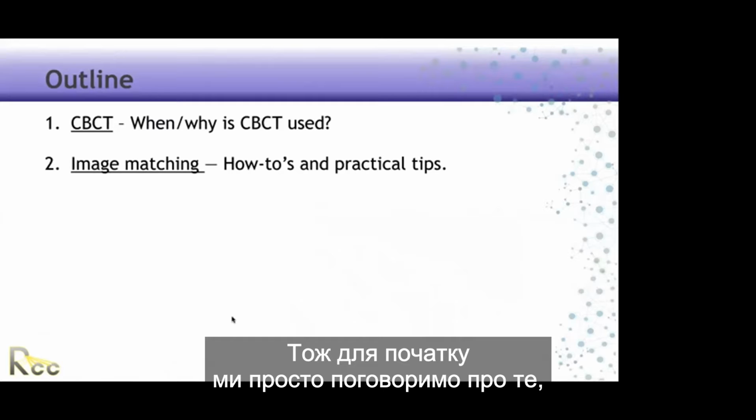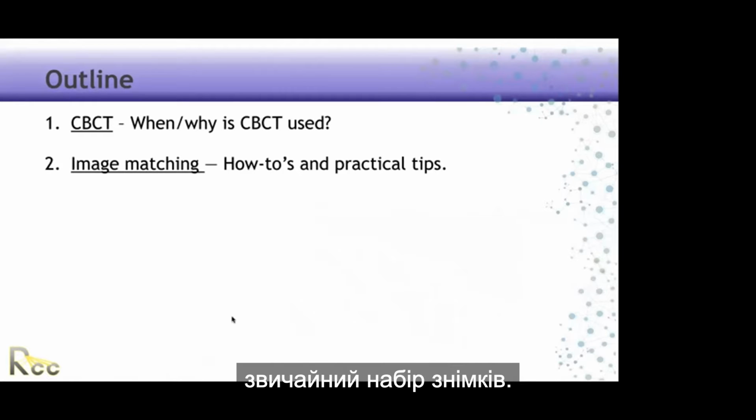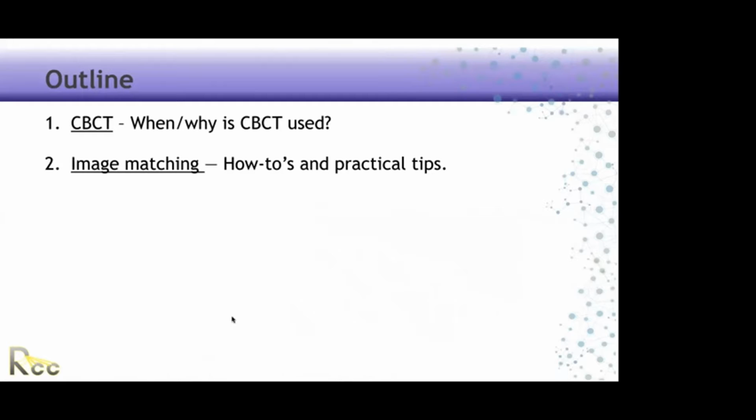So to start, we're just going to talk about when and why we do CBCTs as opposed to just taking a regular set of images. And then we're going to go over matching, how to match different anatomy and tips that we have for each particular anatomy.